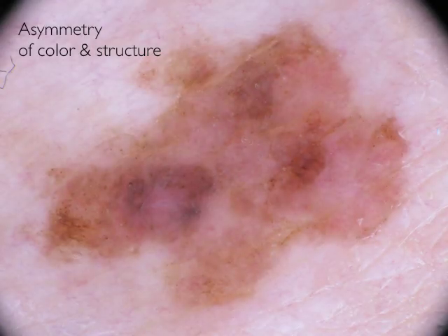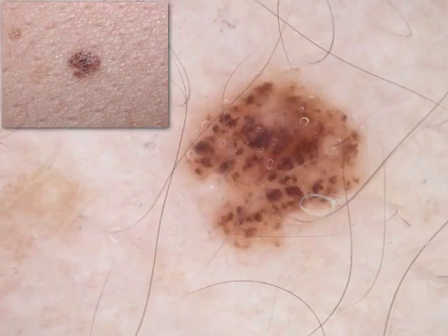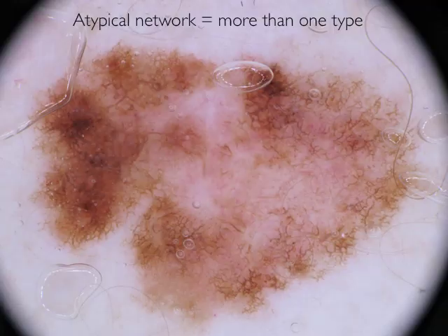This is an example of melanoma showing clearly an asymmetric distribution of color and structures. We don't care too much about the shape of the lesion when evaluating the dermoscopic criteria. Also here, an example of melanoma showing asymmetry of color and structures. And here, an example of a nevus showing a little bit of asymmetry of shape, but we don't care about this. The only thing is the distribution of colors and structures. And in this case of nevus, this distribution is quite regular.